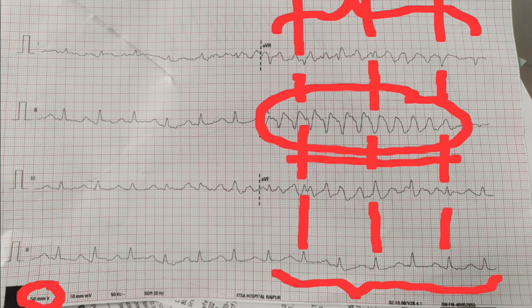But if the patient is hemodynamically stable, his vitals are stable, and you find this ECG and you see that it is not correlating with other parts of the strip, and there is a QRS complex that can be documented in the artifacts, you should always reconsider your plan of management and not run into shock or giving amiodarone. Rather, you should repeat the ECG or reset the leads attached to the patient.